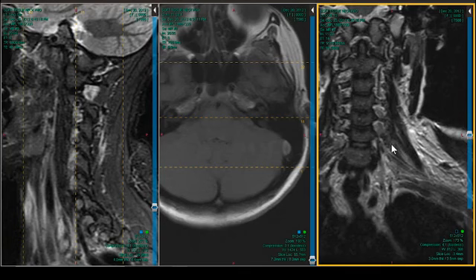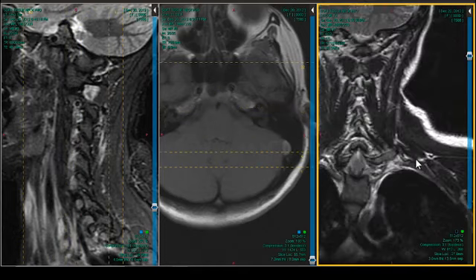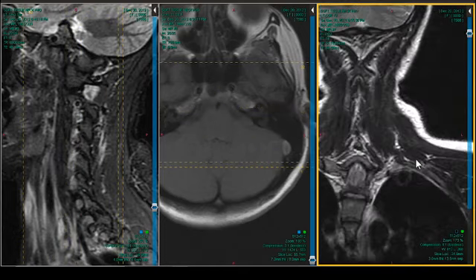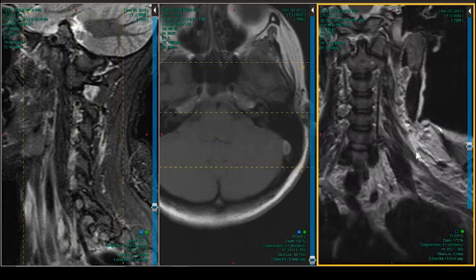This is how I think about a case. I think of it from the clinical side. What could be the problem? And then I look for the findings that could explain the problem. Brachial plexus looks terrific. The axillary space wasn't completely studied, but there aren't any major nodes. And if I hadn't found the cause, I certainly would have made sure that I had a great look at the brachial plexus. All right, shall we move on? Yeah.